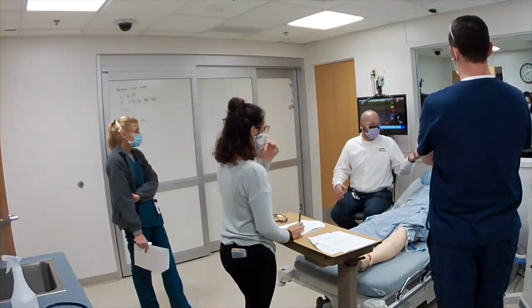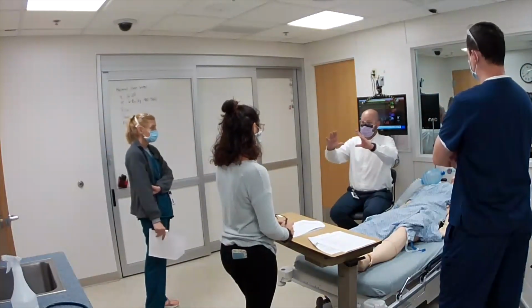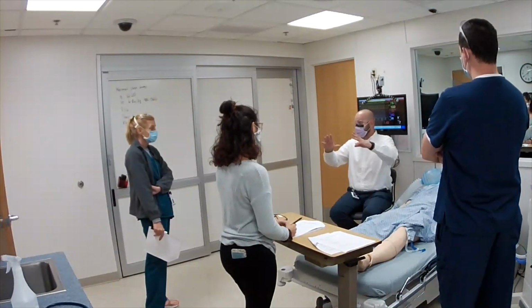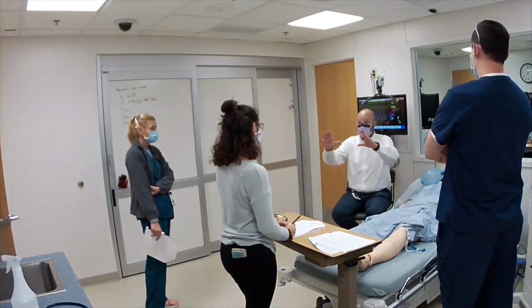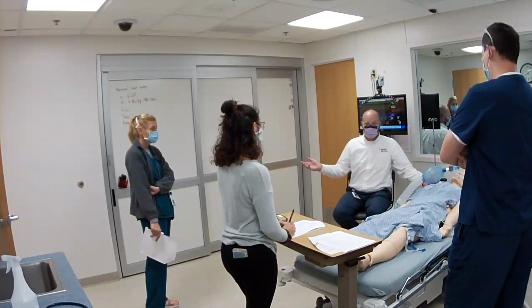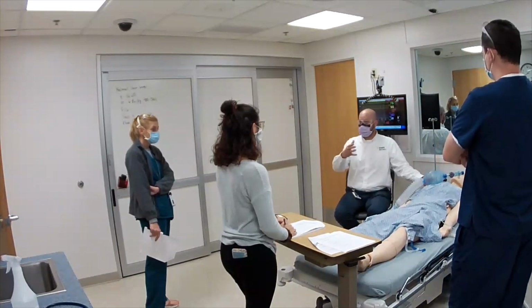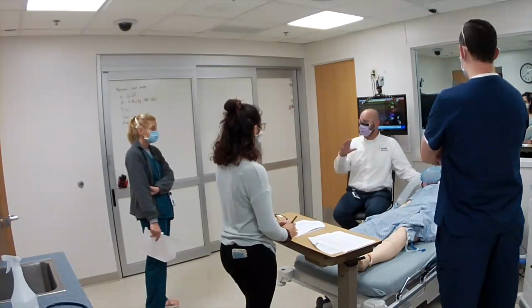In volume support, we're gonna give them an extra volume in their face, right? So they're still breathing, and instead of giving them extra pressure on their breath, we're giving them extra volume in their breath, right? Does that make sense? Yeah, right. Perfect. SIMV volume, pressure support. Okay, so what is SIMV?